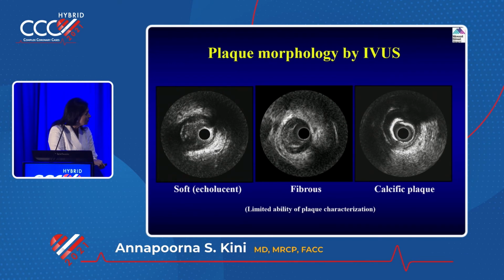So this is soft plaque, right? Now, if you see calcium, C is calcium, you don't see any ultrasound going behind. So that you know is calcium. You see that?